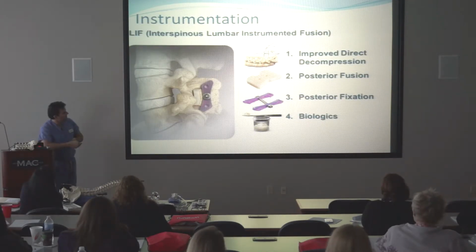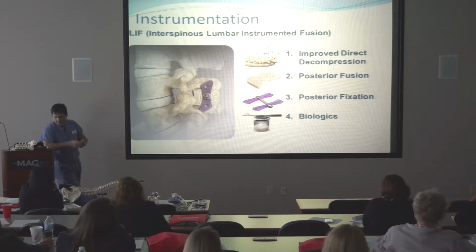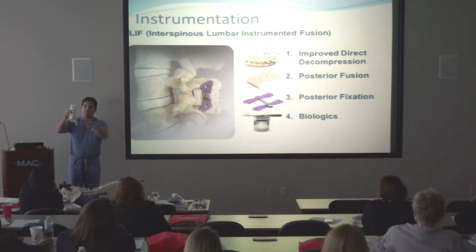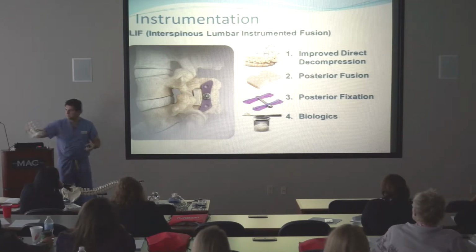Instrumentation. This is that less invasive procedure. Instead of using pedicle screws, which I'll show you both, we're starting to use the spinous process instrumentation, where this implant basically grabs on and clamps these two spinous processes together with bone graft in between, so that the fusion happens between these bones that are projecting out the back of the spine. So that goes in between the spinous processes back here, which keeps the bones from moving, but also helps them fuse together, so you don't have to open a much bigger incision, move more muscles out of the way, and cause more muscle damage to put in pedicle screws.